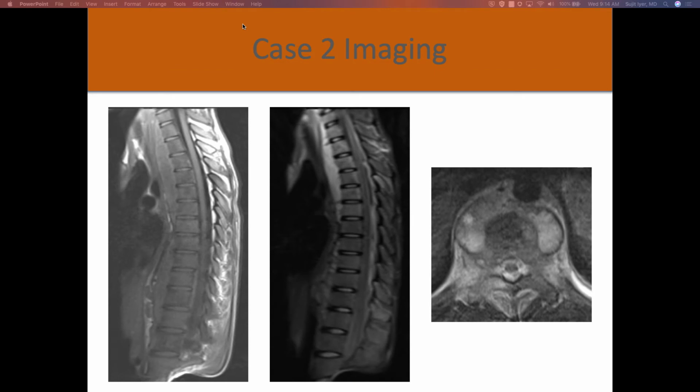Some more imaging, MRI, looking at the different views. I think this is an MR of the thoracic spine showing some prevertebral inflammatory changes in the upper thoracic level, indicating more extensive infection. The vertebral end plates do not seem to be involved in this region. It's more prevertebral inflammatory changes.